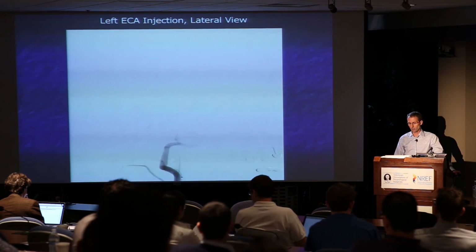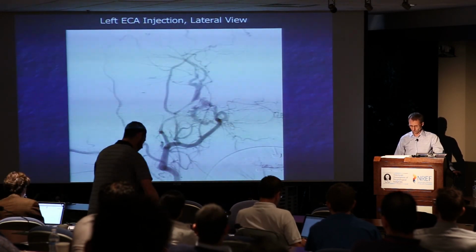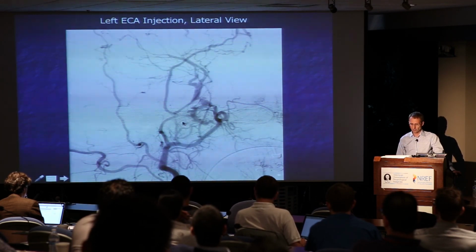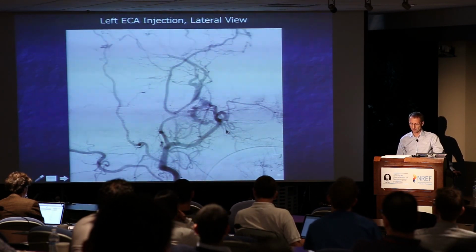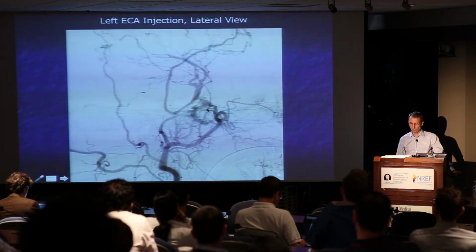And again, this is the angiogram. This is the left external carotid artery injection. I showed you this earlier. And what we see is here's the middle meningeal coming, the superficial temporal, internal maxillary obviously running forward. Is there something clearly not normal going on in this general area?